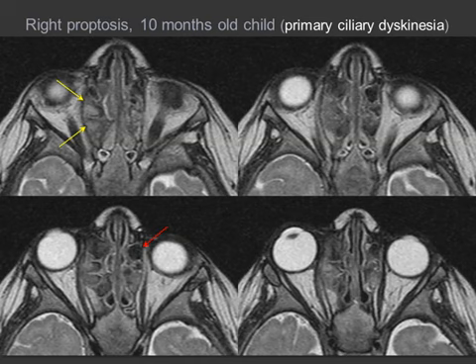This is a condition in which you can have a fluid that shows progressive inspissation, losing water and having much more protein content, therefore changing the magnetic properties of this fluid, which is much more similar to toothpaste rather than to fluid.